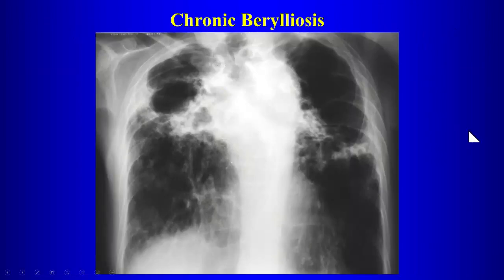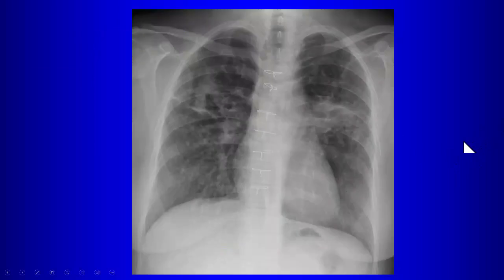Here's an end-stage case of chronic berylliosis. There was actually an outbreak of this in Newark, where they had a light bulb factory, and patients were coming in with berylliosis. It was well before my time, but anyway, chronic berylliosis. This was a case from Newark.